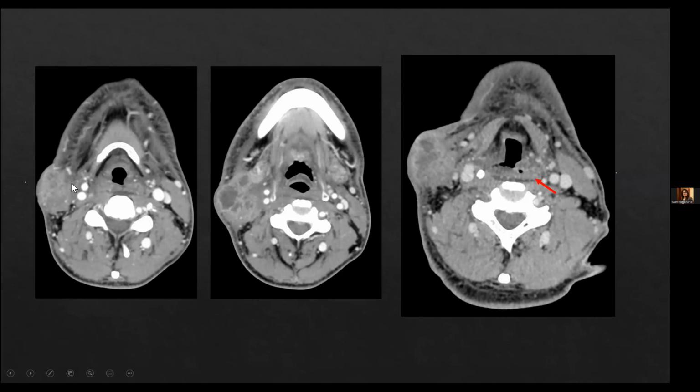After palliative CRT in the present patient, we can see that the disease burden itself has significantly decreased. This is another finding which I have not discussed in this case because I'm discussing mainly the pre-treatment imaging. What we are seeing is this edema in the soft tissues, which is very commonly seen in post-treatment, post-RT cases of larynx, of any kind of radiation treatment changes. So this should not be confused with disease. These are basically subcutaneous edema. The nodal mass has also decreased significantly in size, and the primary disease is also significantly decreased, now limited only to the left piriform sinus.